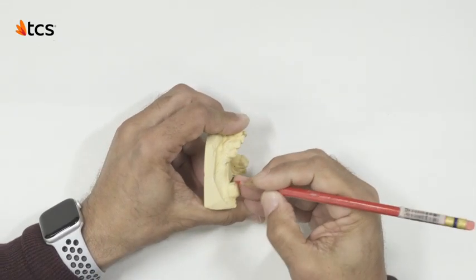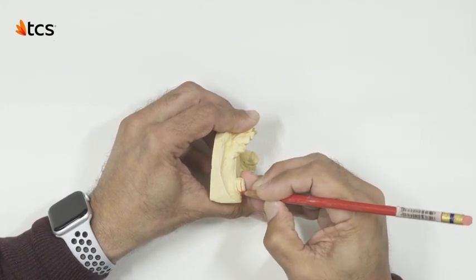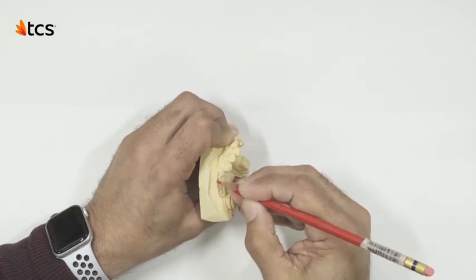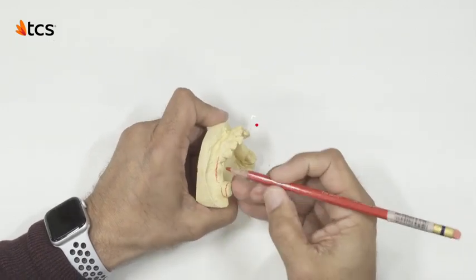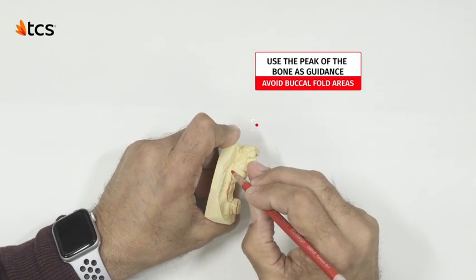On the buccal side, we add a high finger clasp design to this molar for retention. This allows us to avoid the tissue part of the clasping that can cause discomfort to the patient. Moving forward, we avoid overextending to the fold areas. Instead, we stay at the height of contour, using the peak of the bone as our guidance.